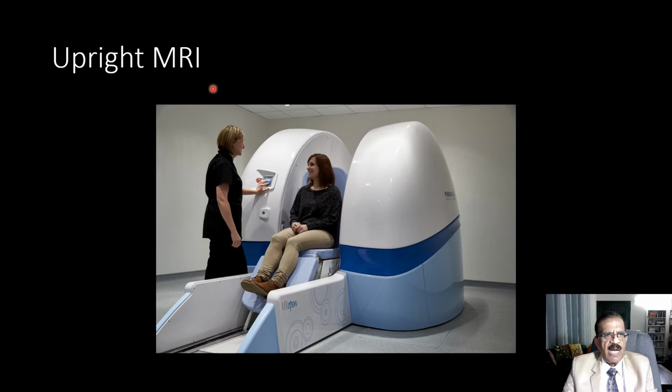This is an upright MRI. This should be, of course, the least claustrophobic. The person is sitting comfortably, as if sitting in a business class seat of an aeroplane. And these are two magnets. I think this is perhaps the best in the market.